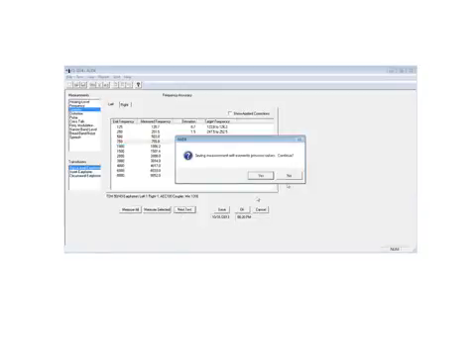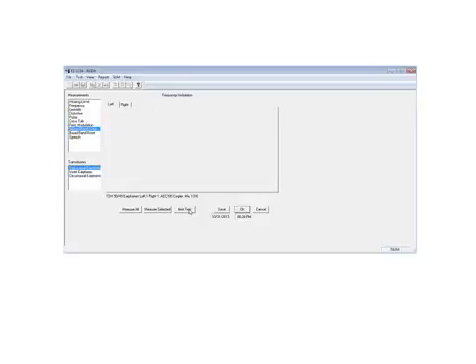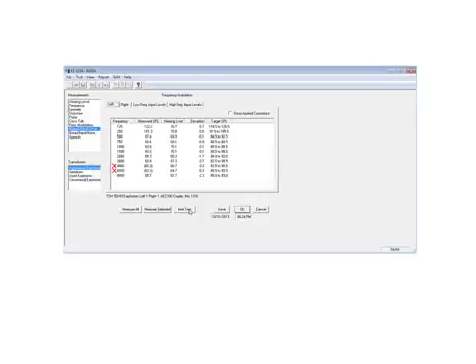The test is becoming quite an extensive test. The next test they call a narrowband noise. If you take your FM radio and put it off station, you can hear somewhat of a white noise. Definition of white noise is equal energy per hertz. And we can also get a narrowband noise, which goes up in frequency as we change our frequency meter. So we go to the next test. There's again the broadband noise. That's the white noise, as commonly referred to.